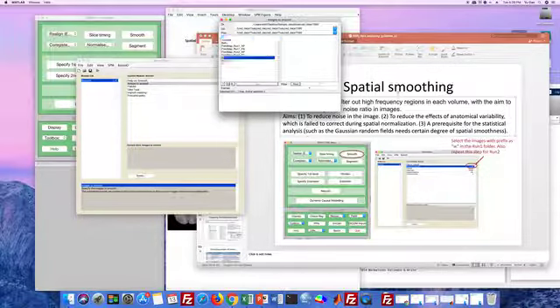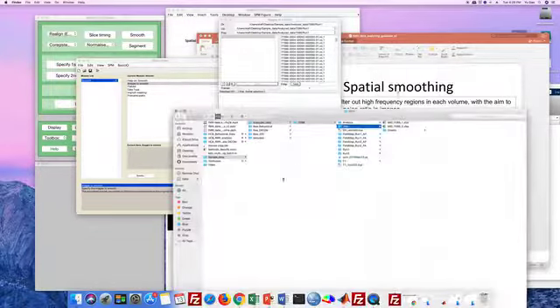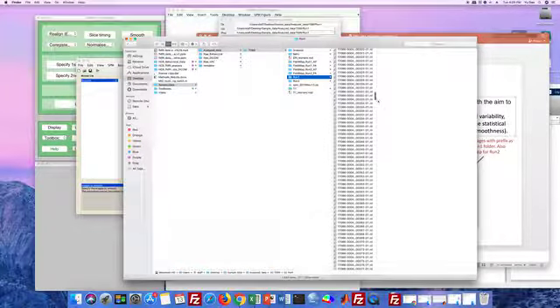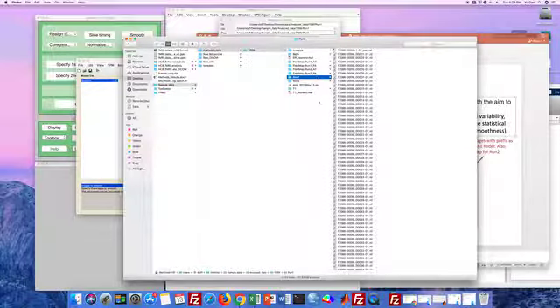So first click run 1. After normalization, you have some new files with the prefix W. You have 540 new nii images with the prefix of W in each run's folder.